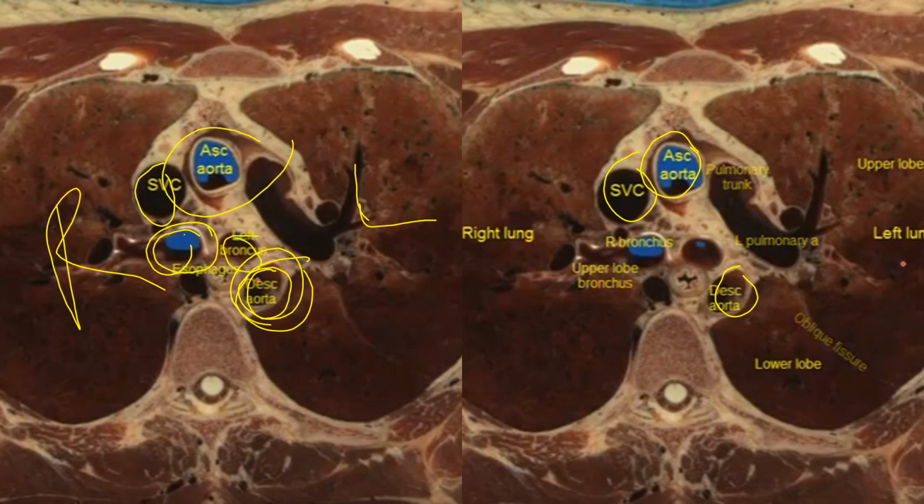So here is the carina in between these two, right? That's the carina. As we're going down, notice the scapula have disappeared at this point, so we're getting further down there. The pulmonary trunk, that's this thing here. If you're looking at the left picture, on the right picture is actually marked pulmonary trunk. Right, this is the pulmonary artery where the deoxygenated blood gets sent to the lungs.